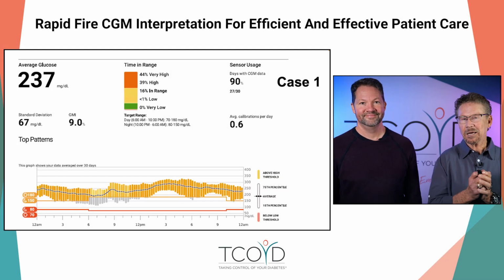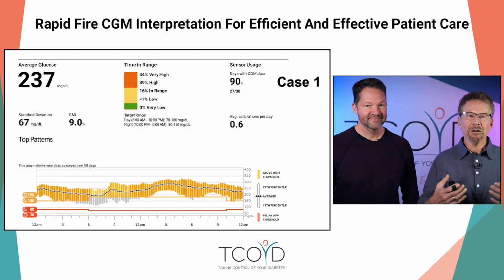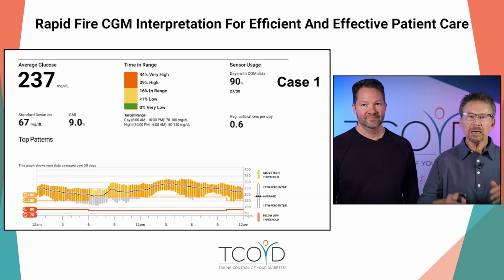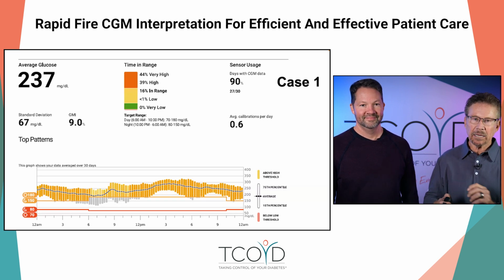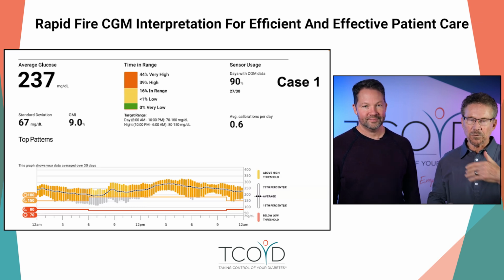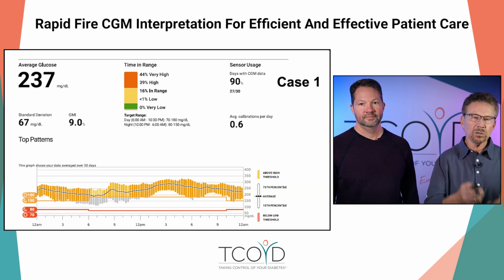Okay, now it's time for rapid fire CGM interpretation. I went through a lot of effort to get the cases and set it up where he doesn't know a single thing about these cases because they're my patients. He's going to give an example of seeing a patient maybe for the first time, looking at their download, the first time they got a CGM, and he's going to do what we just suggested for all of you to do to review.